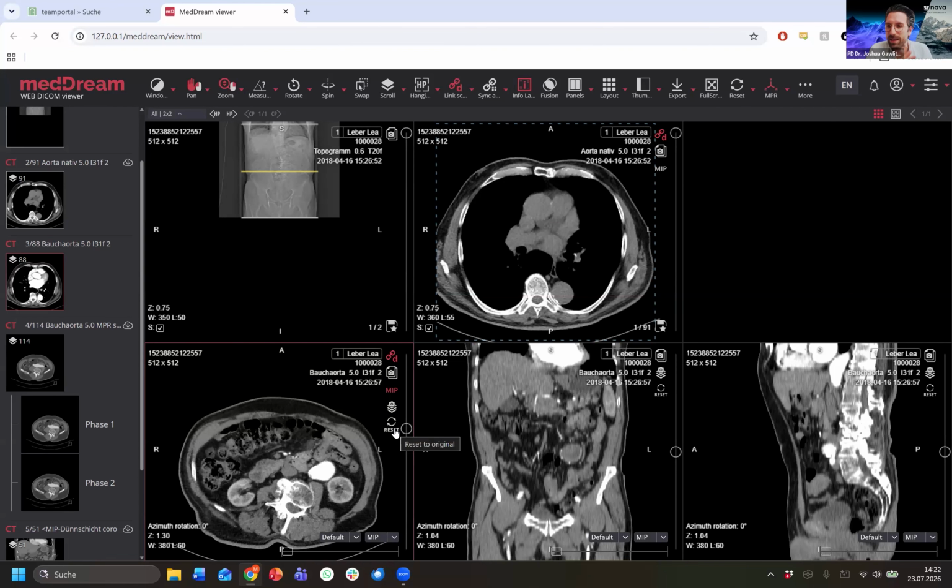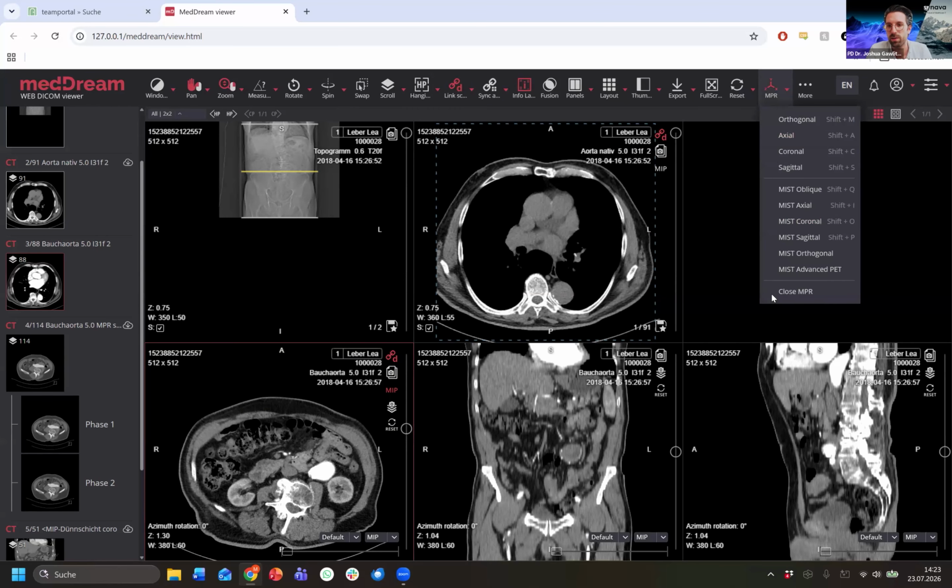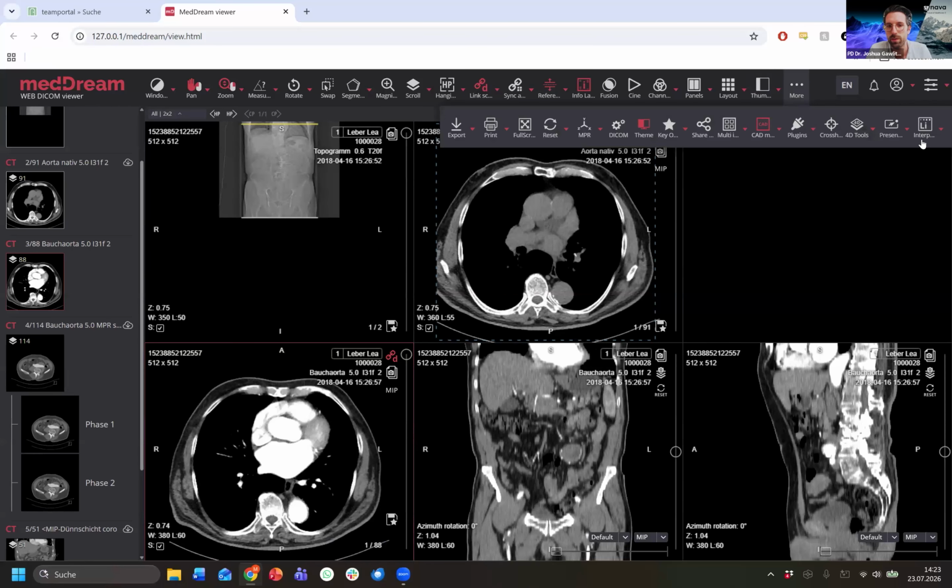And this is a classical viewport that you want when a study first comes in. Sometimes in the clinic the CT machine is only rendering the first images, for example in the emergency room, and then you only receive the first images. Then you click here, and for the very first time you have all the information that you need. So this is something that is really, really nice.